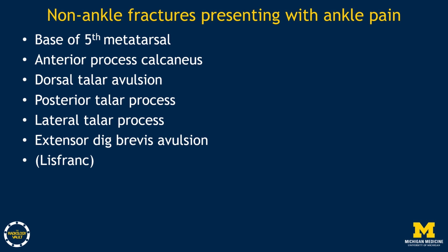After looking at the malleoli, look for these injuries. The Lisfranc joint is not covered here, but don't forget to assess this region if foot radiographs are obtained with the ankle radiographs.